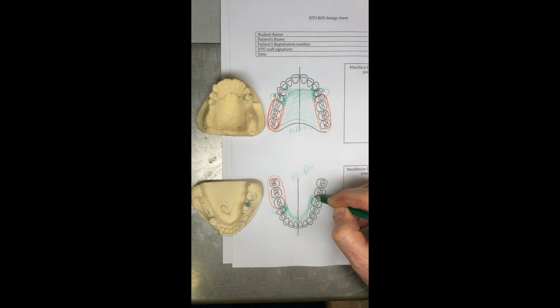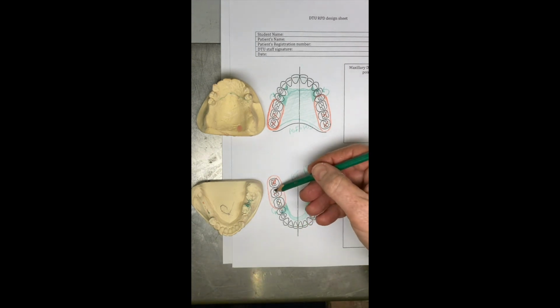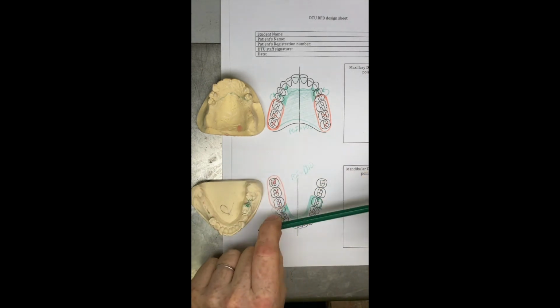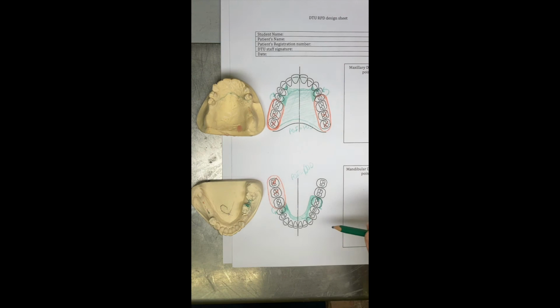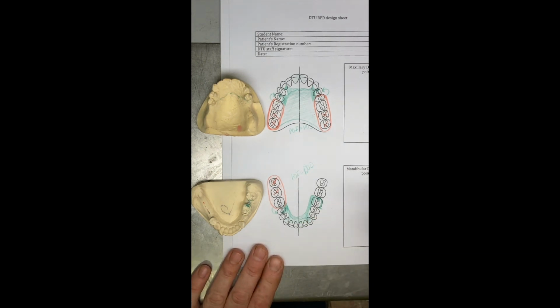And then finally we can think about indirect retention, and for indirect retention we're going to be looking at what happens when we pull up on the occlusal surface of these artificial teeth, and we're going to start rotating about an axis between these two clasp tips. So we want some indirect retention by putting a cingulum rest on the teeth in this area down here, and again a good compromise would be onto the cingulum of that canine just there like so, and that will provide some indirect retention. If you really wanted to go for it, you could bring the metalwork up onto the cingulum of all of these lower incisors and produce a lingual plate, maybe a little bit over the top in this case.